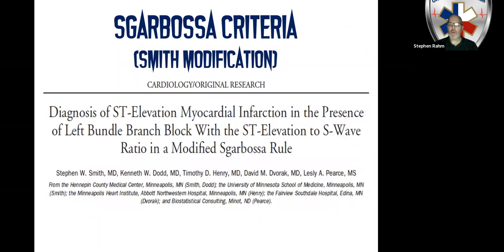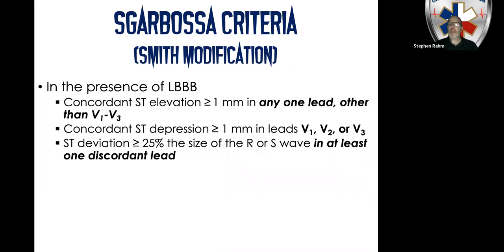In 2012, Dr. Stephen Smith and his group re-looked at her original criteria. There are 3 components of this, and specifically he looked at the 3rd component and made some modification to it, because her 3rd criterion turned out to be not very specific and not very sensitive, for the simple fact that she didn't take the rule of proportionality into account. I'll elaborate on that in just a second. So the Smith modification of the Sgarbossa criteria, which have been validated, by the way, are what you see on your screen.